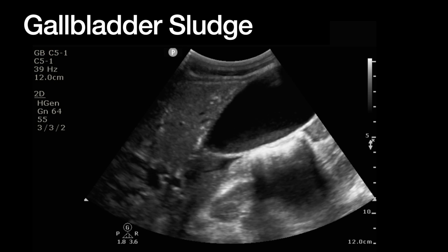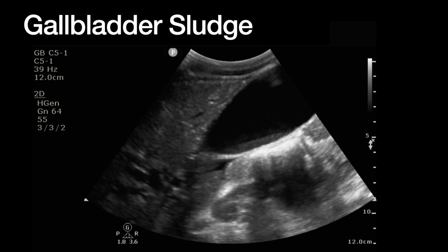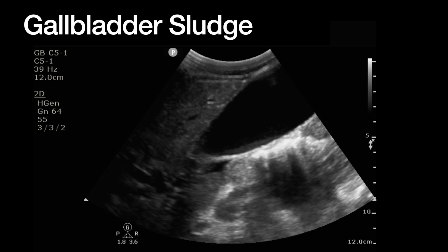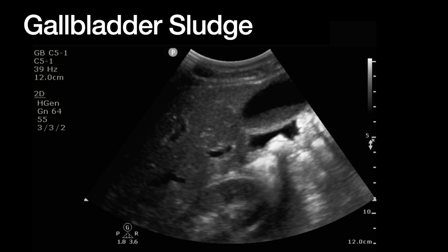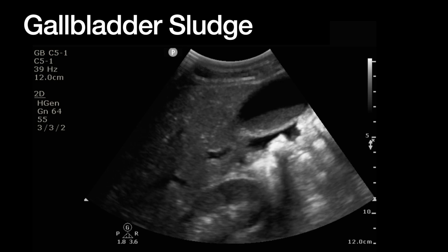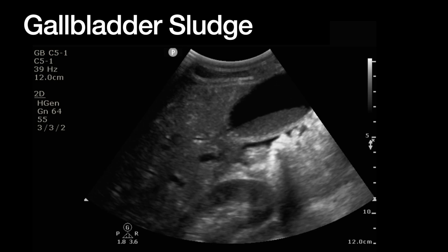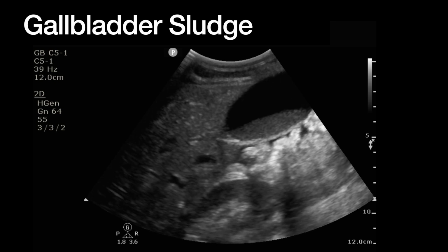And there's sometimes this crystallization of cholesterol and calcium bilirubinate that creates this sandy, sludgy mixture of stuff. There's some debate, but I think it's generally considered to be a risk factor or something that can potentially develop into gallstones, so it's something to keep an eye out for as you're scanning through these patients.